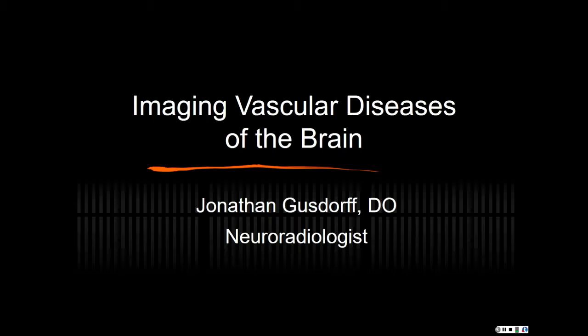I'm that confident. If there is something bright on the DWI, also known as diffusion-weighted imaging images, I immediately go to the ADC maps, and I find that lesion that is so bright. If it is dark on ADC maps, D is in diffusion, ADC maps, that's acute to early subacute ischemia.